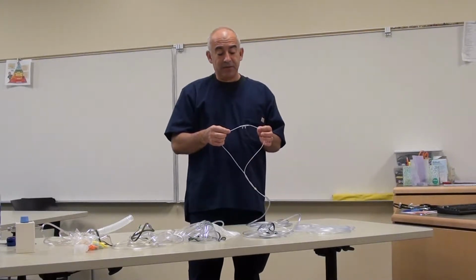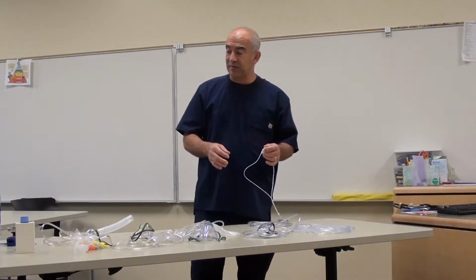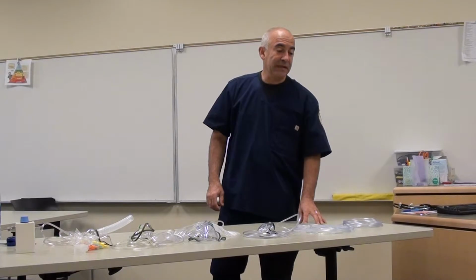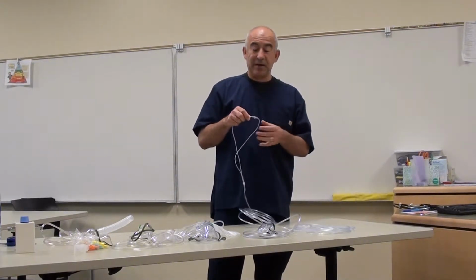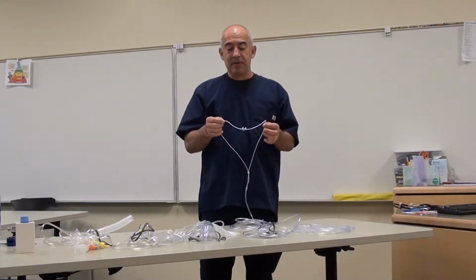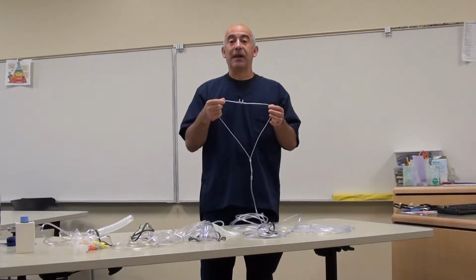The way that you would assist a patient having nasal dryness from this particular device is that you would use a humidification device, like a bubble humidifier. You put the bubble humidifier in line between the oxygen source and the nasal cannula itself, and it would humidify the air and hopefully relieve the patient's nasal dryness. Best uses for this particular device are patients that are stable and patients that require long-term oxygen therapy at home.